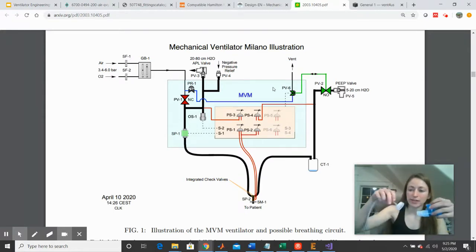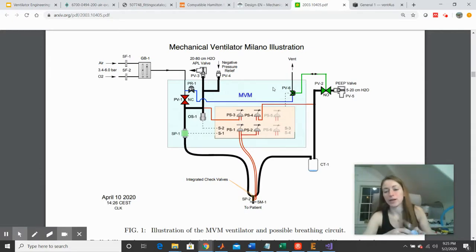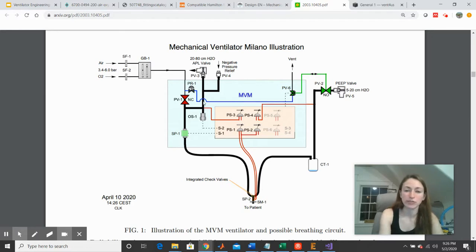However, if you have this cap with the vacuum tubing from your pressure regulator, then assuming this device is connected, when you have airflow from the pressure regulator and airflow from the expiratory end, this diaphragm will effectively be in equilibrium and the valve will not release pressure to ambient, right? So you'll be able to control this type of diaphragm system by using a pressure regulator and maybe something like a solenoid to modulate this PEEP valve. So it's a pretty simple way to maintain your PEEP level if that's what you're shooting for. So when you see these sort of takeoffs from the high pressure side, that may be something that they're targeting.